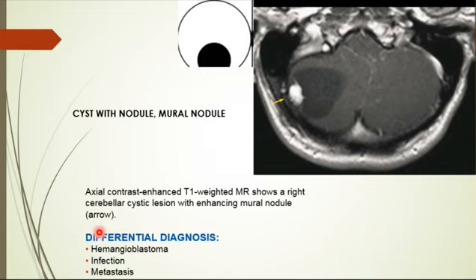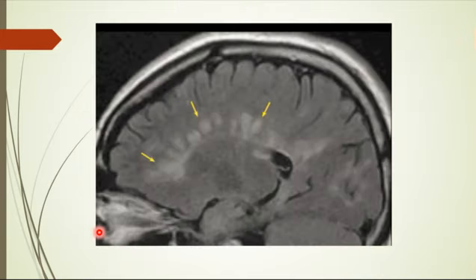Last time there was a discussion on this sign. What's this? This is Dawson fingers. Previously, the one we saw, I think, was the string of beads sign. It was just dots. These are Dawson fingers. They are not like the onion ring.